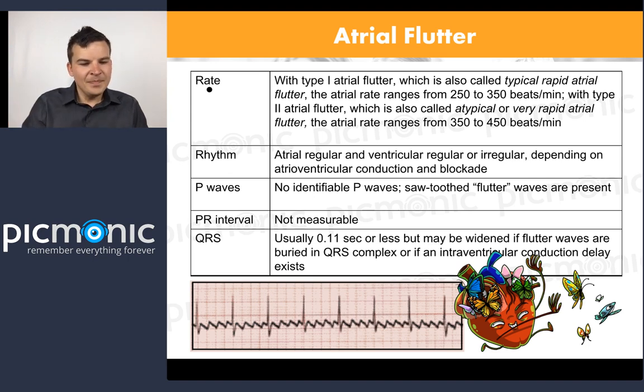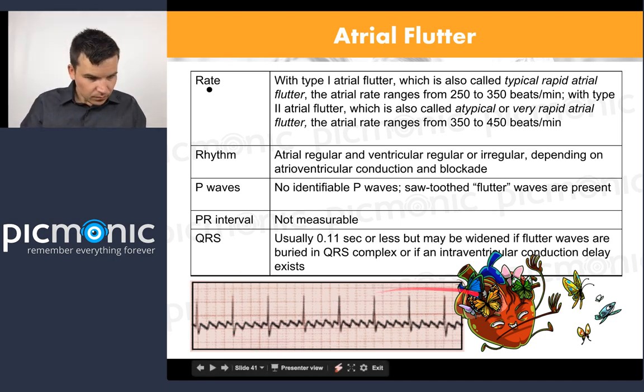That's the whole point. So you know that the P waves themselves are essentially atrial depolarization, which should ideally, if the electrical activity is connected to the muscle tissue and working in harmony, every time a P wave happens, that's atrial depolarization. So then we can count P waves to count the amount of atrial depolarization, or the atrial rate. So what's the atrial rate here? Well, you could just literally count all the way across again and then multiply by 30, right?